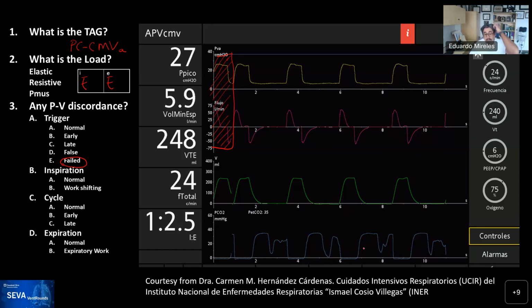So this patient is completely out of phase. It's not triggering any breath, and it's breathing in between. Essentially Pmus, if I would draw it, is occurring here, here, here, and here, completely out of sync with the ventilator. You could only detect it because of the CO2, and this is a call to the manufacturer of this ventilator to give us the ability to change the gain and scale.